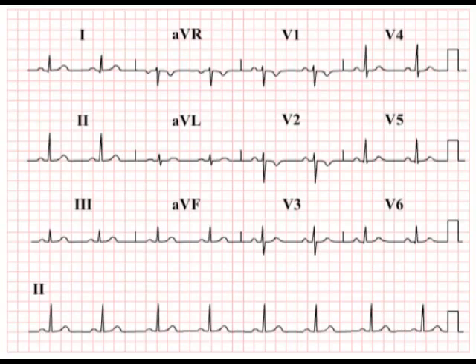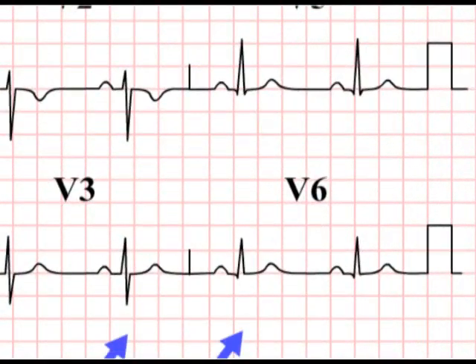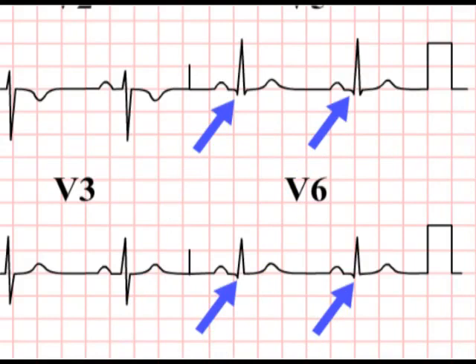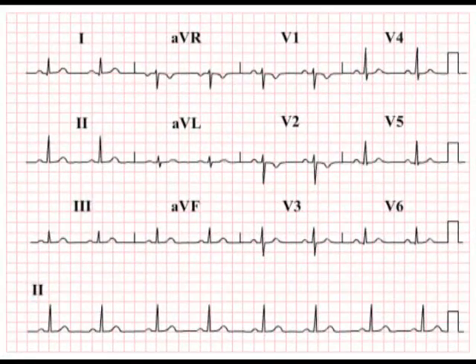We've seen that early left to right depolarization in the interventricular septum is the key to understanding the potential existence of small physiological Q waves in any of the left lateral leads, exemplified here in leads V5 and V6. We'd now like to refine your understanding of septal depolarization and physiological Q waves.